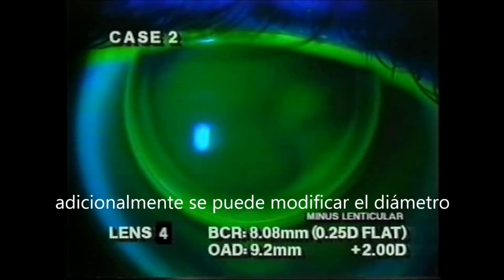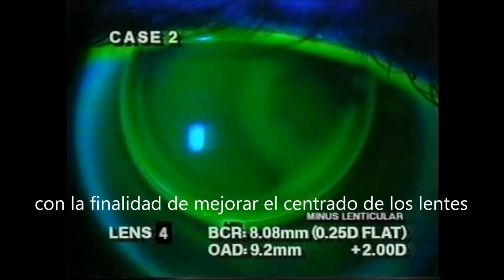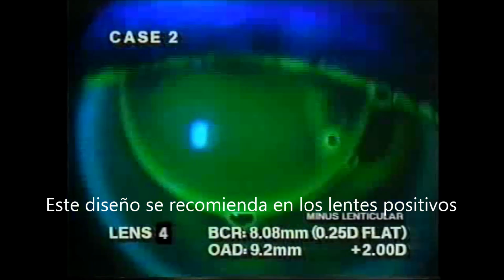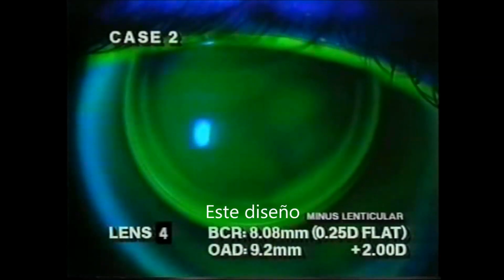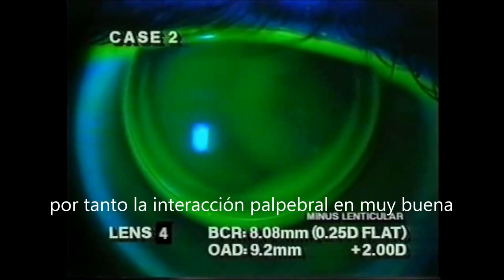A larger overall diameter may assist in providing a more centered lens position. A minus lenticular edge design is recommended for all plus power and low minus power lenses. This design increases edge thickness, therefore enhances the lifting action of the upper lid.